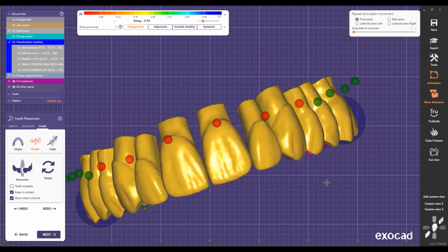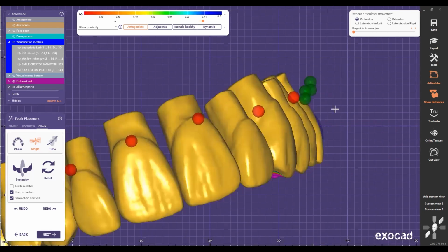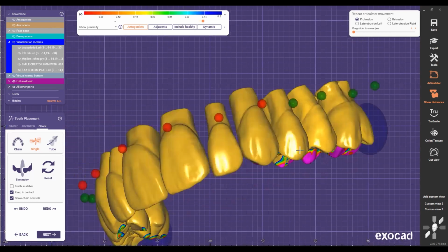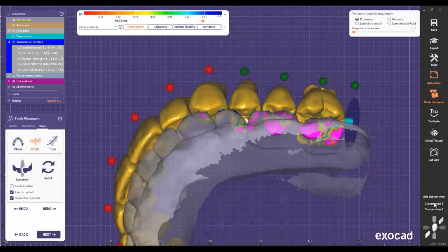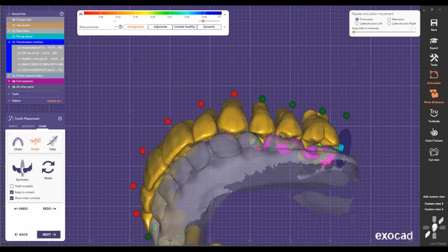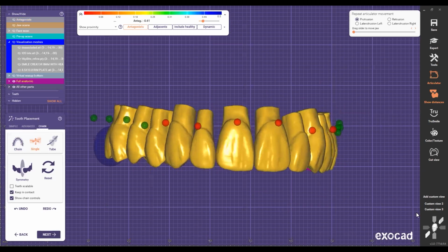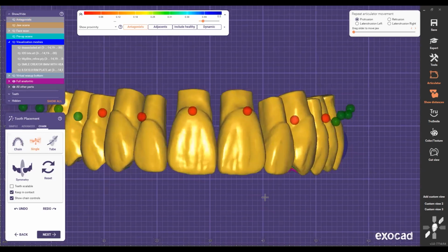I want to see the inclination. Maybe I can change the angle a little bit and create the nice banana effect. And then turn on the articulator. It looks good. So now I'm going to compare if my curve is being moved a little bit higher. Now I can just bring this out a tiny bit, check back. Beautiful. So now I have everything there, right?